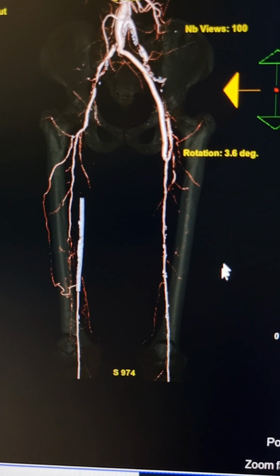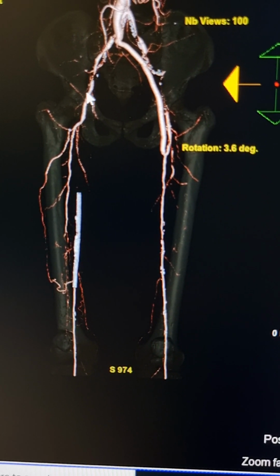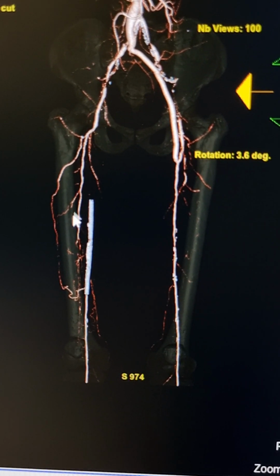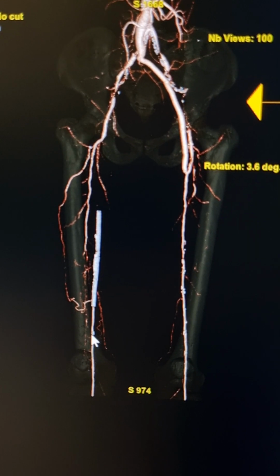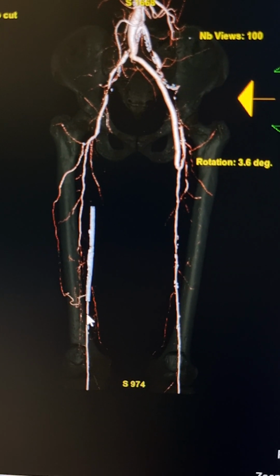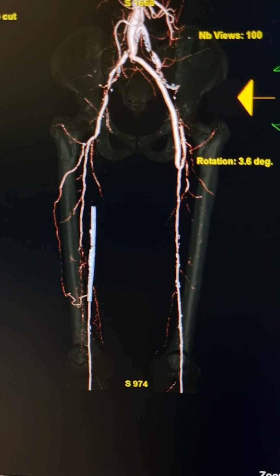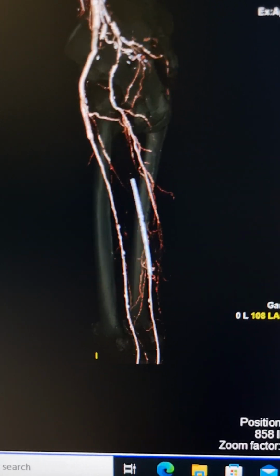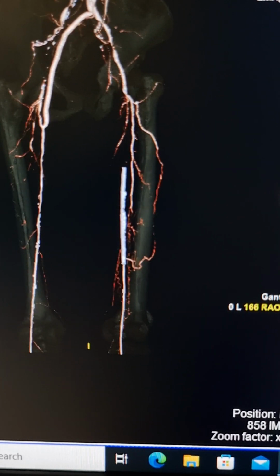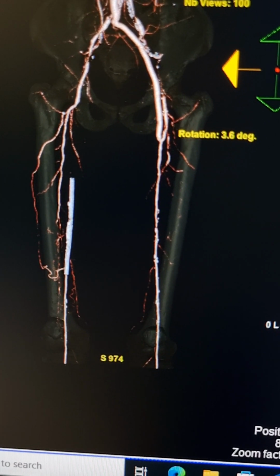Now this is the part in the superficial femoral artery. The left one is patent. This is completely occluded onwards from this place downwards. This was the graft here, and as I've said previously, this part of the superficial femoral artery is patent. So each of these blood vessels has to be documented and reported upon separately. We just cannot sum up in a single report.